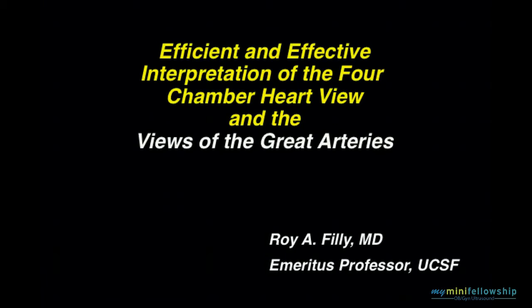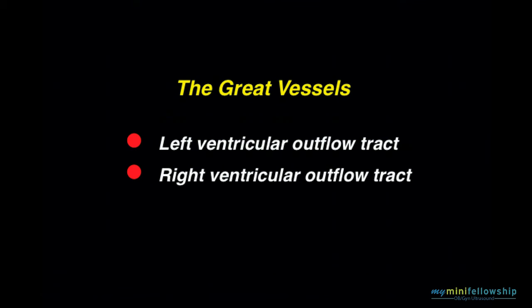We're going to continue our discussion of fetal heart analysis with a consideration of the great arteries. Now, it's very important that you have already viewed the images of and the lecture on the four-chamber view of the heart. That is really a prelude to this lecture. So you're familiar, I'm sure, with the terms left ventricular outflow tract view and right ventricular outflow tract view.